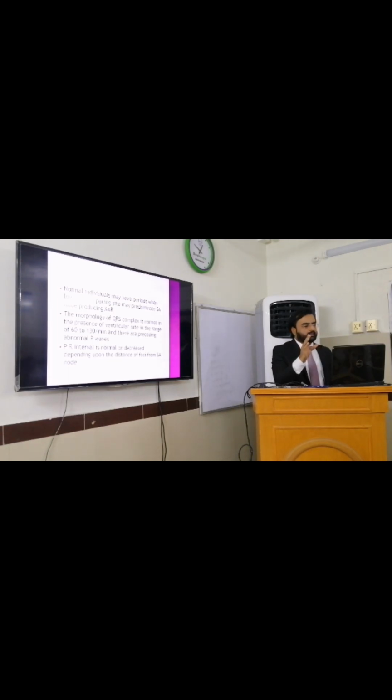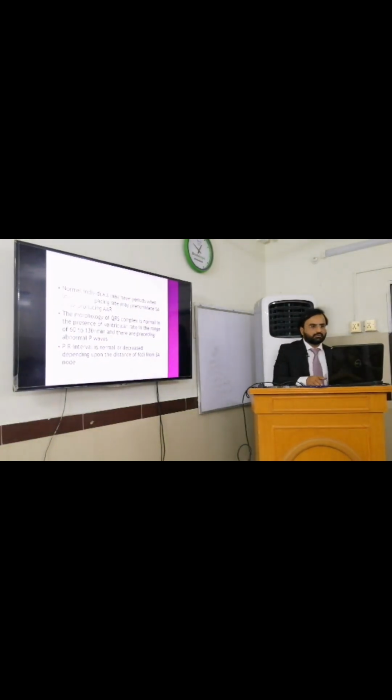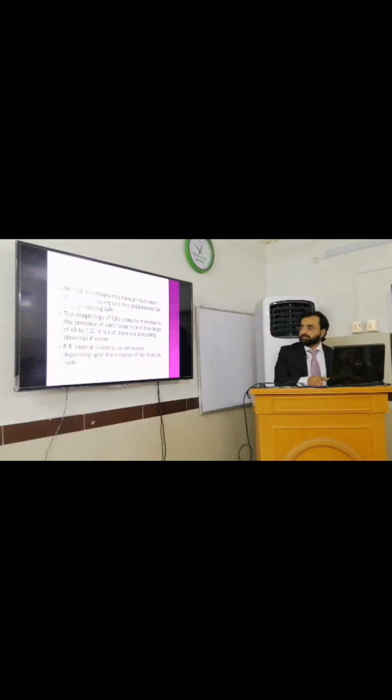It's not going to be wide or have some disruption in the QRS morphology. It is a narrow morphology because the ventricles are excited by the P wave that is coming from the atria. Though it's not from the SA node, it's still coming from the atria. So it's a higher up P wave that depolarizes the ventricle and produces a QRS complex. The rate may vary. It may be 60 to 130, and a little bit on the higher side, because we call it tachyarrhythmia, and in atrial tachycardia the heart rate is higher than in normal resting conditions. And there are preceding P waves that are morphologically abnormal. The QRS is preceded by a P wave, but it has a changed morphology.